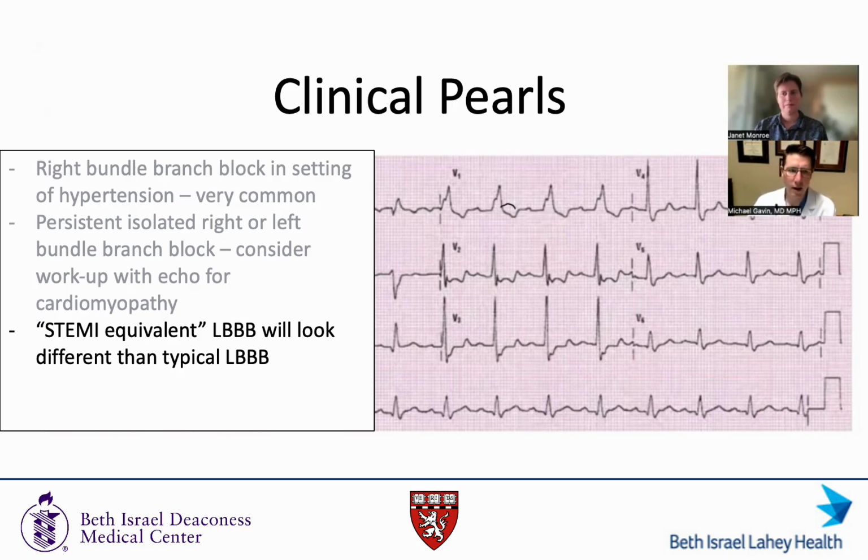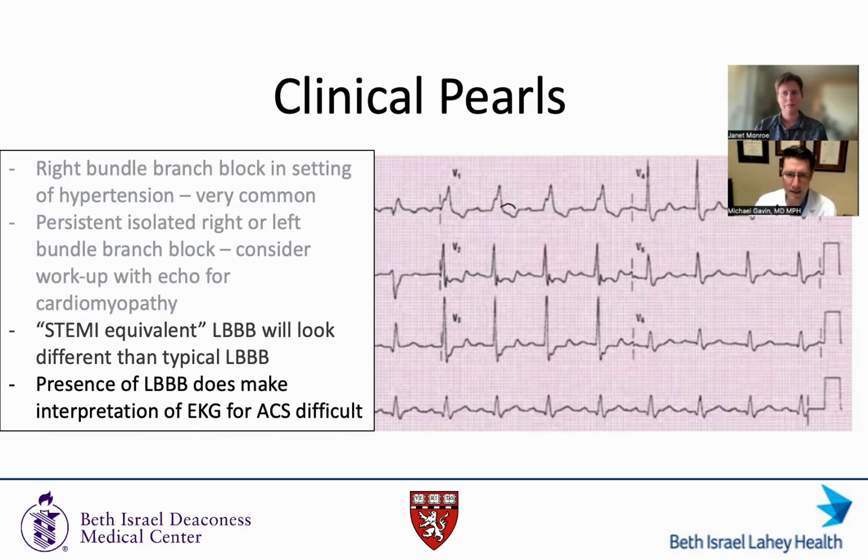Again, when you have a large anterior wall MI, it's typically right bundle, left anterior fascicular block with this elevation here. So that's the left bundle, somebody comes in with chest pain. All you can say there is they might be having ischemia. I just can't tell. The EKG doesn't help me. So I've got to go to something else, namely an echo or an angiogram.